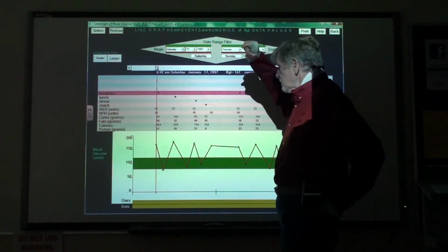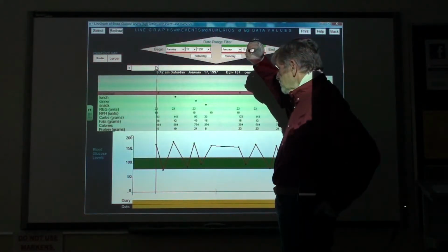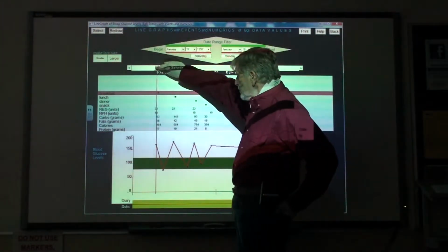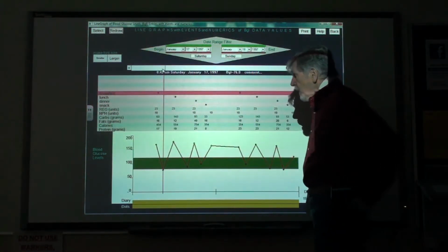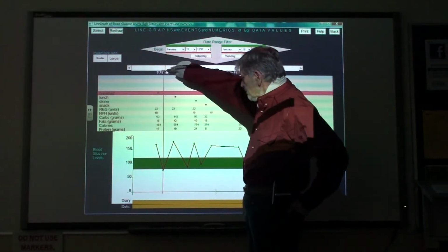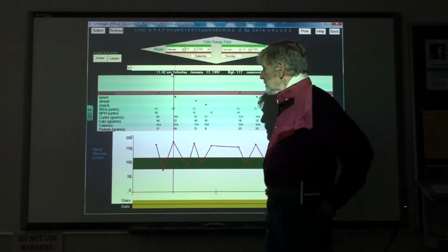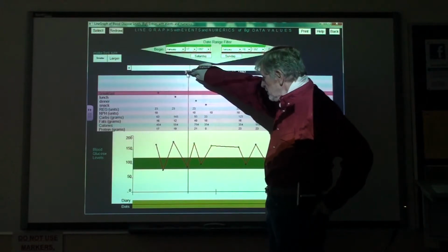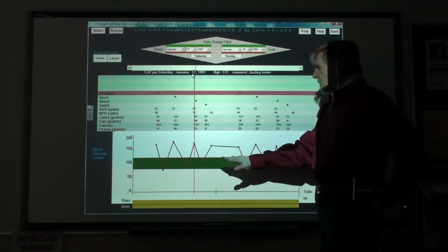And then the insulin was injected, the 23 and the 10. And so the short-term insulin brought the reading back down. It was effective. But what happens is if you wait another few hours, the reading goes right back up again. And so this time they injected some short-term and it went back down. And it stayed down for a few hours, then it went back up again. So every time they inject the short-term, it goes down.